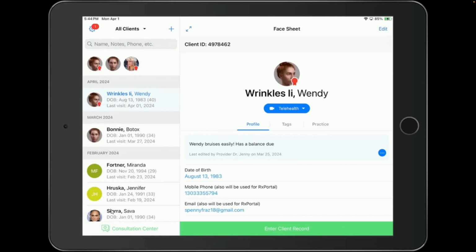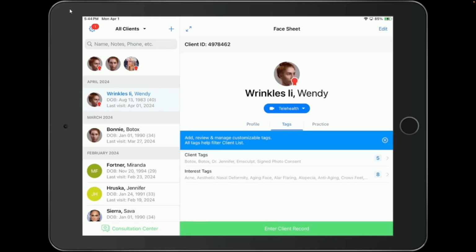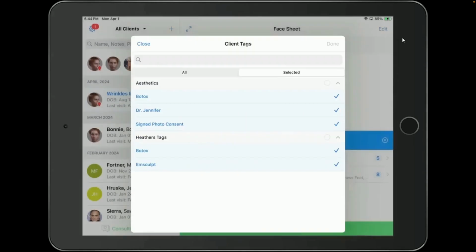So your clients here, the photos you're taking within this, the forms, once they're completed, it's all one system, so it's all interconnected. If you were to use this independently, you can easily use it alongside another EMR, just as that consultation tool and photo management, your forms, it's all being organized per client in here. You're just using it alongside a software. So there's definitely benefits of using it all cohesively, but plenty of clients use it alongside too.